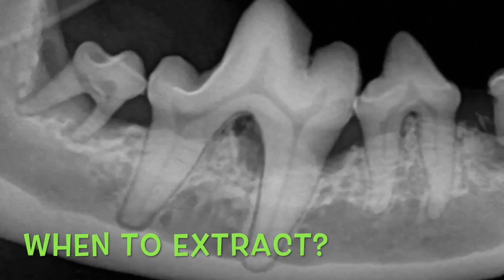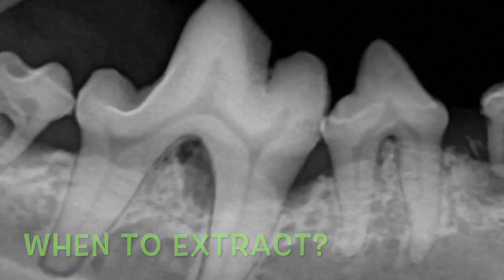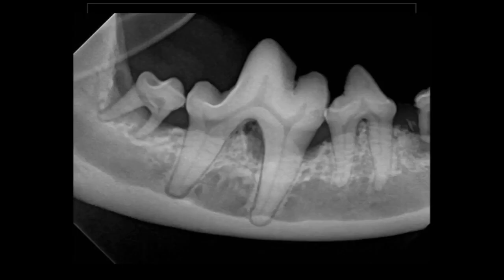When is the best time to extract? Take a look at this radiograph. This is a 4-year-old small breed dog. This is the right mandible. And you can see that there's some significant and varying degrees of bone loss adjacent to those teeth.